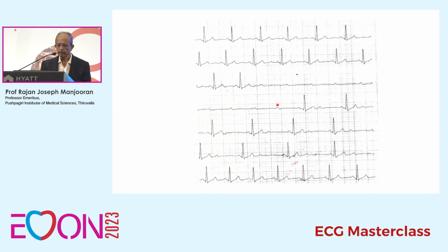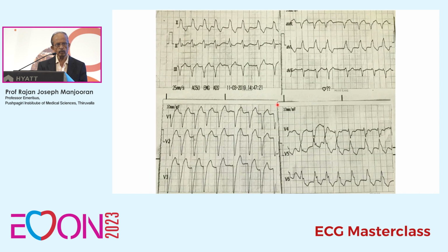Patient is having a Mobitz type 2 block where a large number of P waves are not conducted, and these patients are candidates for permanent pacemaker implantation because they can fall dead, because the P wave may not get conducted and the whole thing can suddenly stop. So this is an indication for permanent pacemaker implantation. Mobitz type 2 arrhythmia is extremely rare. We are fortunate enough to have an electrocardiogram in a Holter monitoring, and that is why I could show you that. Of all arrhythmias, this is only about 1%. So that is why it is extremely rare.